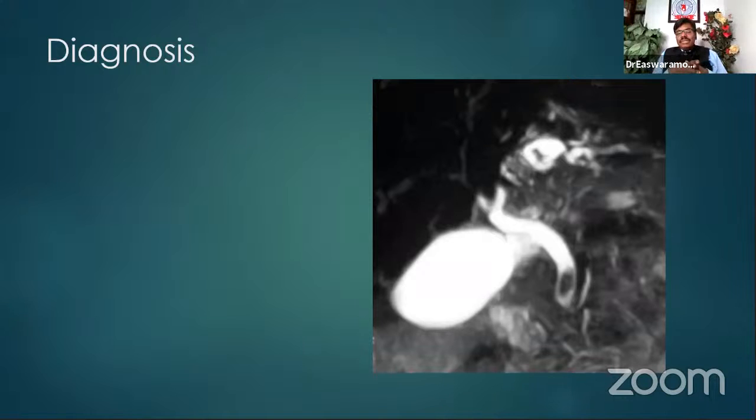Where is the ERCP endoscope? In ERCP, you should see a hockey stick. The endoscope should be there. That's why I said, you go back today and see the YouTube snapshot of the picture I showed you for ERCP. The endoscope should be seen like this. Here it is nothing. This is actually a typical picture of MRCP, showing a distended gallbladder. This is the T2 weighted image. If you want to go specifically, there are a lot of things you can learn, but it's too much for you.